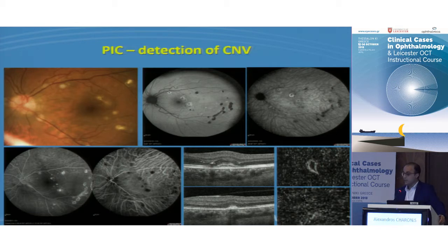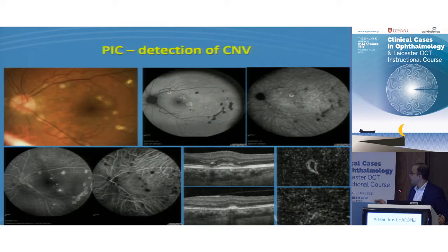So if we look into these pictures here in the B scans, this is an area where we do have blood flow, and this is an area where we do not have blood flow. And if you look at it with the blood flow signal, it really helps. Now, inflammatory lesions do have some blood flow, but it's much less pronounced and doesn't have the pattern that you see in choroidal neovascularization. So detection, follow-up and monitoring of CNV helps us in an inflammatory choroidopathy.